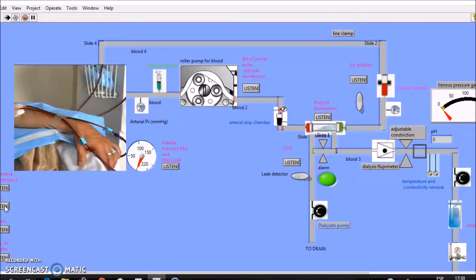Audiovisual checks. If any leak is audible, check with soapy solution. Check that all seals, connectors, adapters, and parts are free. Check all moving parts move freely and all holes are unblocked.